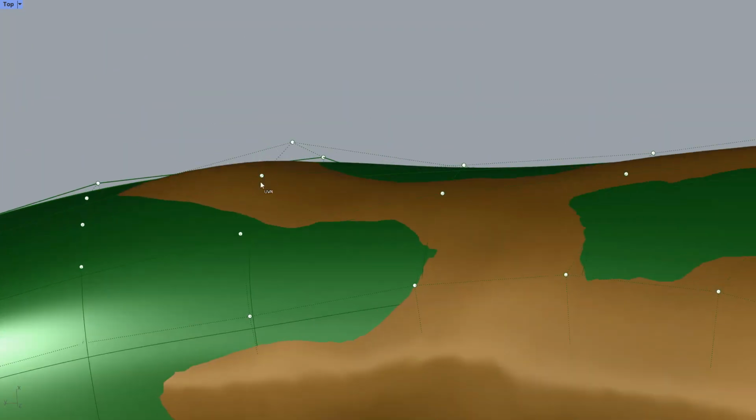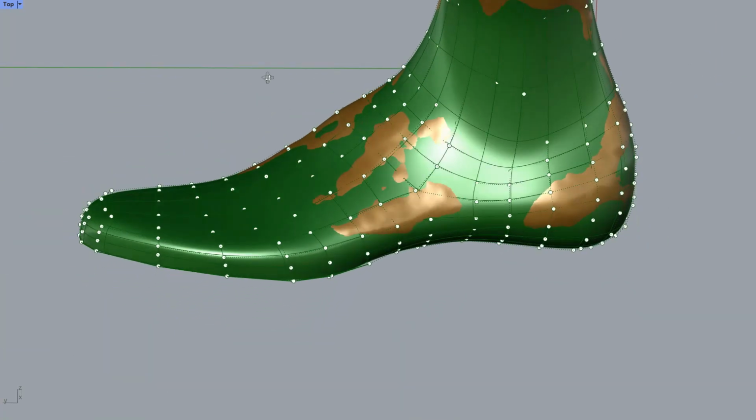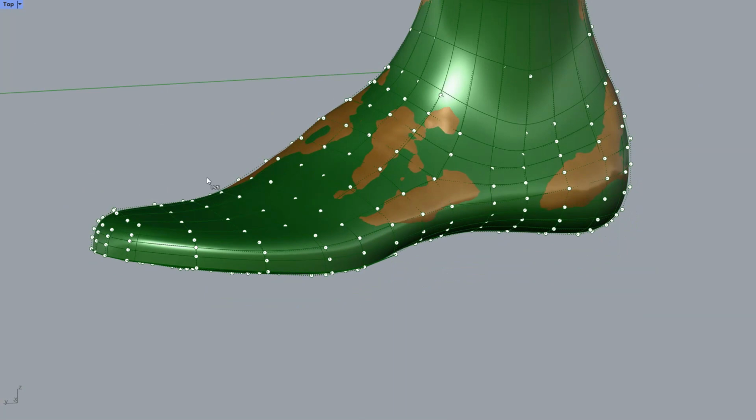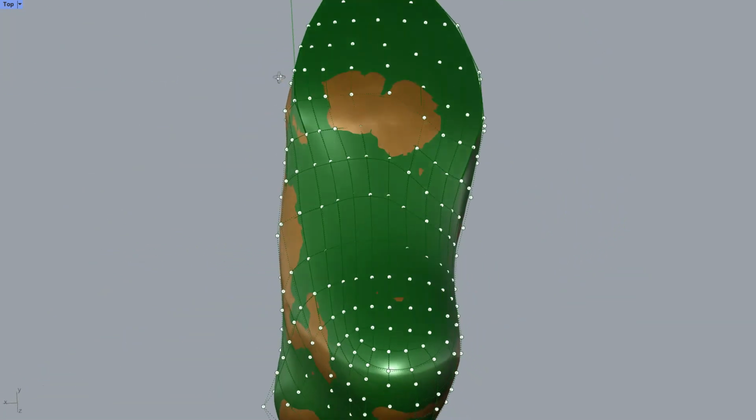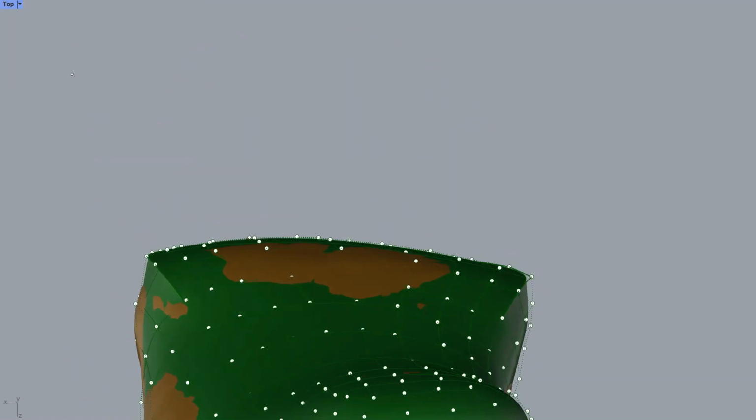Often I have here less room. I just make it more tight than the cast. But if you don't want it, you can give extra room here too. So those things are very important to be able to manipulate, and that's not always the case in many CAD systems.